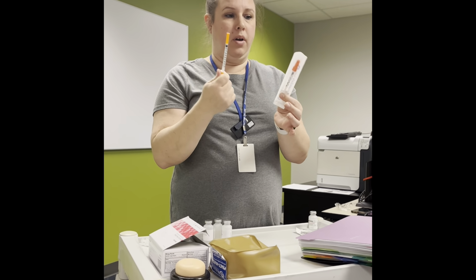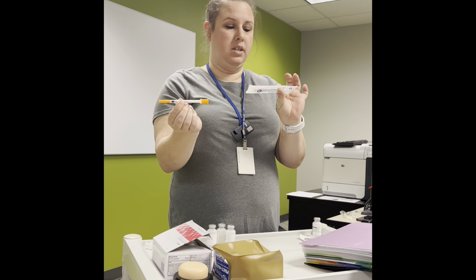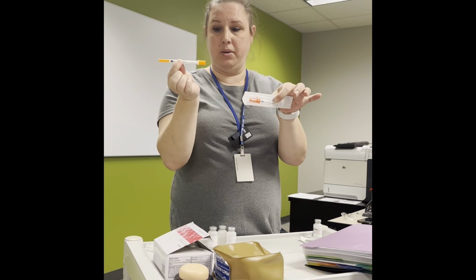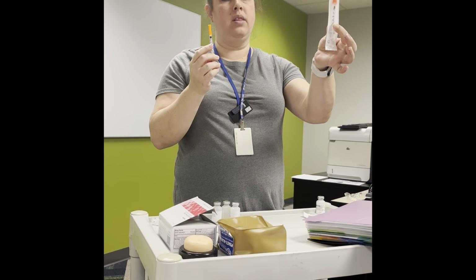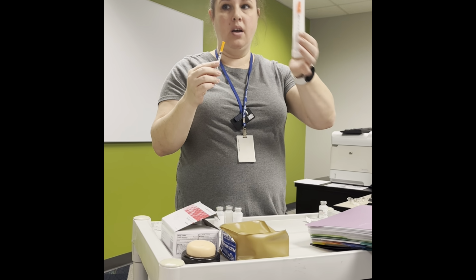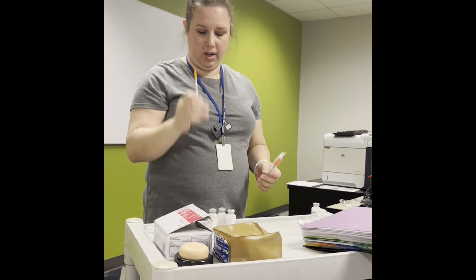Depending on what I grab, I'll try to grab the 100. But the 100 unit, first off, will say U100 insulin on both sides. So you should know that that's the insulin one that we're gonna use for the subcutaneous. The 100 one comes, every line is 2 units. The 50, every line is 1 unit. So in case they give you a 50 while you're practicing, you know that every one is 1 unit of insulin. This one is 2 units per line.